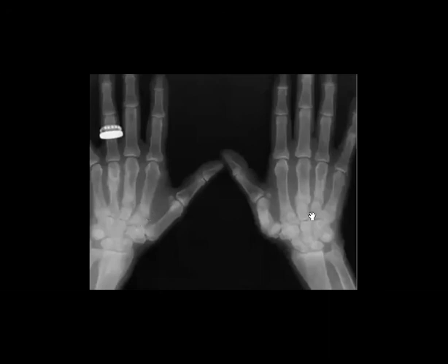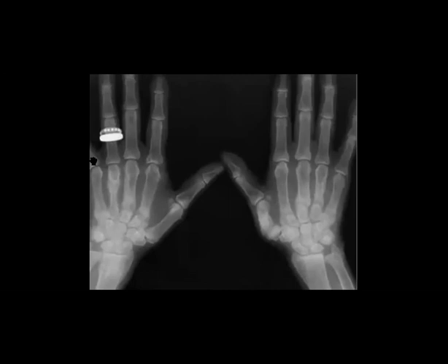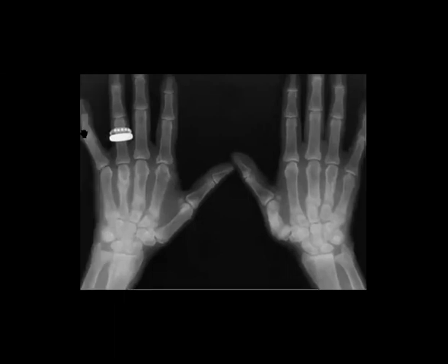Yeah, sclerotic edges. Okay. So osteopenia, let's try to think now. Let's have a method that maybe can help. Now you have a checklist, you will try to fulfill the checklist, and after that you will get some titles.